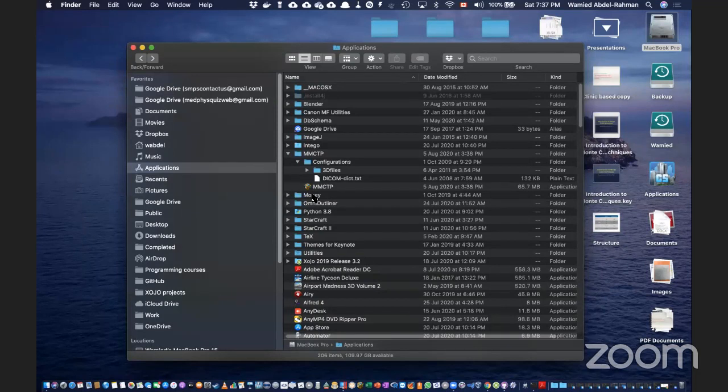This executable, there are bugs in it for Catalina. And I have actually downloaded the source, modified some stuff, and now it works. But don't be surprised if it does not work with temp. Just let me know if you have Catalina. I will give you the correct executable, and you can play with that. Okay, but it has problems.